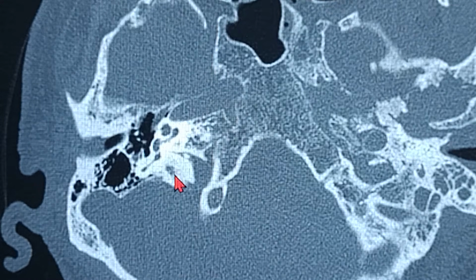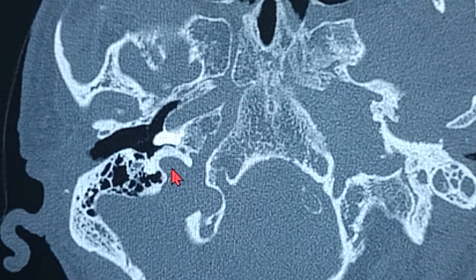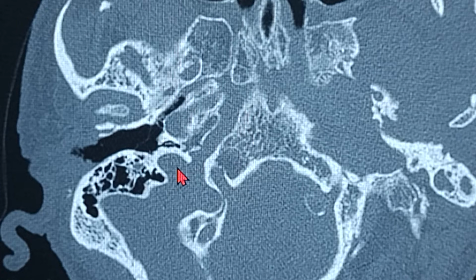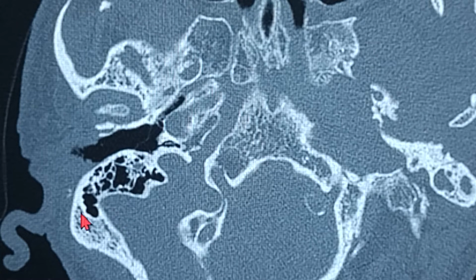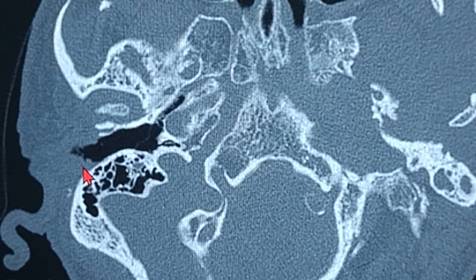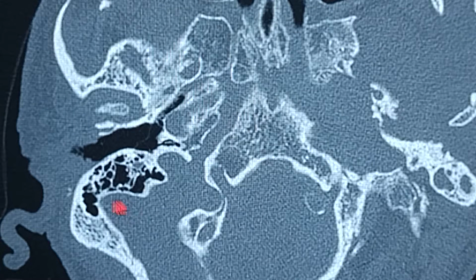I'm going up. This disappears right now. Okay, so this is the place where you can see the jugular bulb. So we are going from below to above. The jugular bulb is below, the carotid is below, and this area you can see over here, that's the sigmoid sinus, the very far lateral, that's the sigmoid sinus. So if you're doing an MRM, the most posterior structure, once you're drilling, you can see that's the outline of the sigmoid sinus. We have to be careful with this sinus.